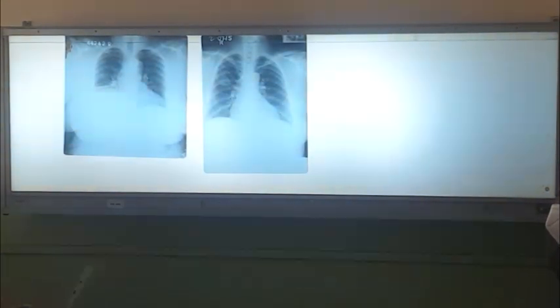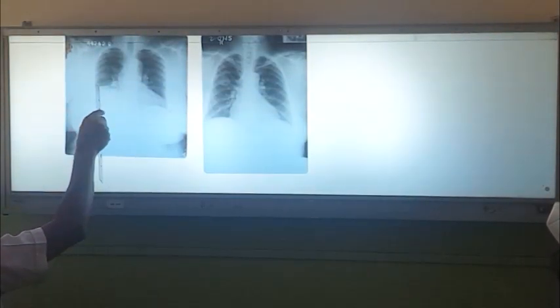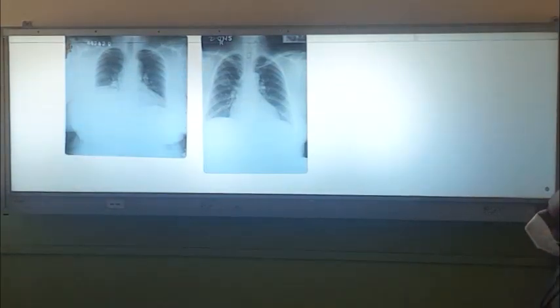During inspiration, your diaphragm goes down with the contraction. But here what happens, it will go up when you try to inspire. So all paradoxical movements. So this is a paralyzed hemidiaphragm. When there is a paralyzed hemidiaphragm, you can see some atelectasis also. Sometimes you can get basal pneumonia also, right?